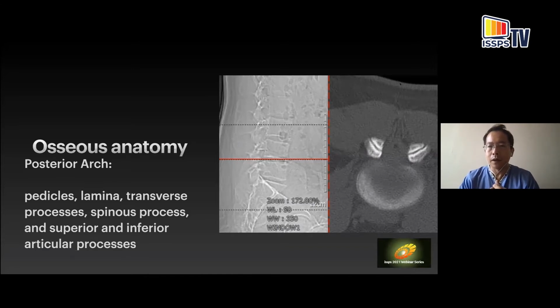So there is potentially, on a CT-guided injection, a space where there is no traversing bone through which you can place a needle in the midline, straight down between the two limbs of the very tough ligamentum flavum into the epidural space to get an epidural injection. We move down again, one more level.